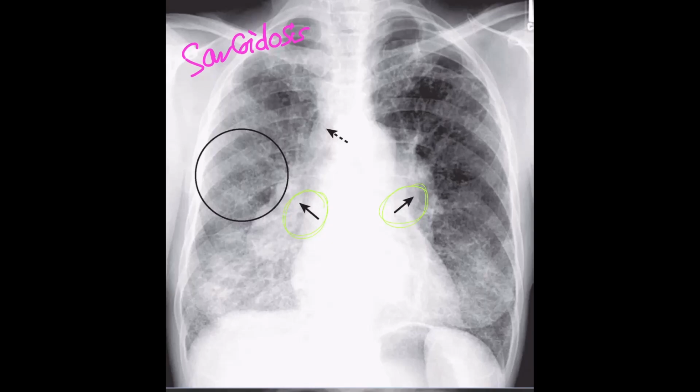Plus the patient has diffuse bilateral interstitial lung disease, reticulonodular, and this patient later with treatment can have lymphadenopathy regression, and some patients have persistent interstitial lung disease, but with treatment some of the patients actually may recover.